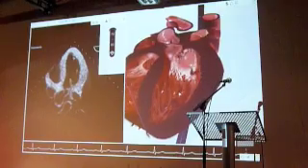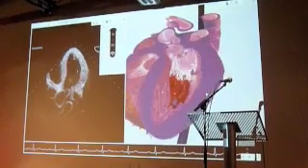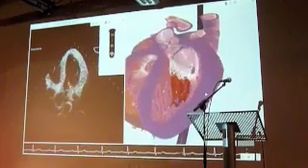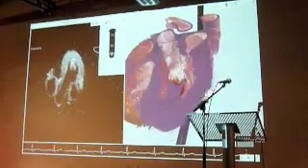And again, this ability to select structures, if I actually select a structure in the 3D view, you see it actually highlights on the ultrasound view there, so students can really correlate any structure, and again it ties in with the anatomy textbook.